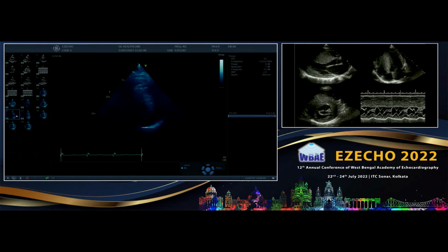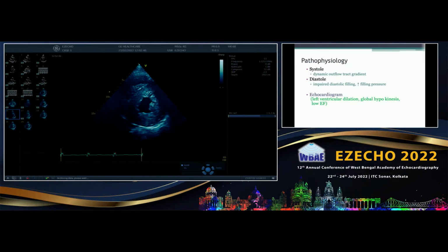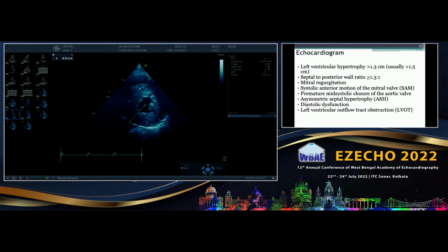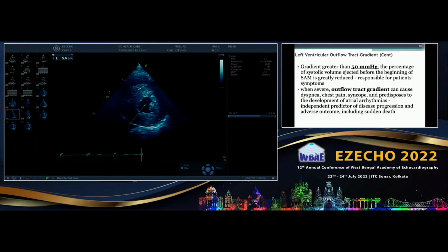So you get a perfect round and measure in the radial directions, correct? So I think here it also looks quite good. This I think looks quite big. This looks quite big. So anyway, it can be any focal point. So that is one point. Then the next point on the HCM.